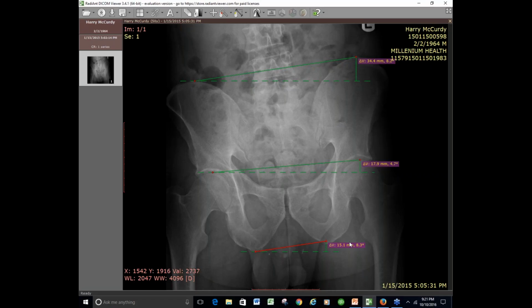Right. So that was my math, taking this 15.1, having written down already that it was 10.8 before, rounding them off, brought us to 5. I get it. Yes. Well, 4.5, right? So you could go 5, you could go 4, you could go either way. That's what that rounds off to. And that's exactly what made this guy level. Thank you.